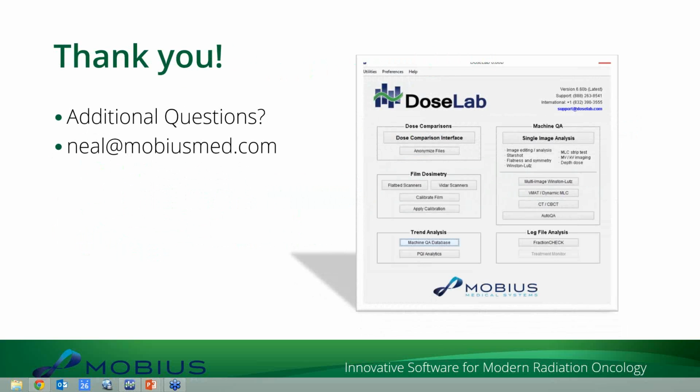From Auto QA, can you save all the results to the Atlas database at once? Again, I'm not that familiar with how we save to the Atlas database, but actually, let me just try something once. I'm not sure right off the top of my head. So let me just run that for a second, and I can't even remember what it shows in the results screen, so give me just a second, I'll let you know that. Can the Winston Lutz handle KV and MV images in the same analysis, or do you need to do them separately?